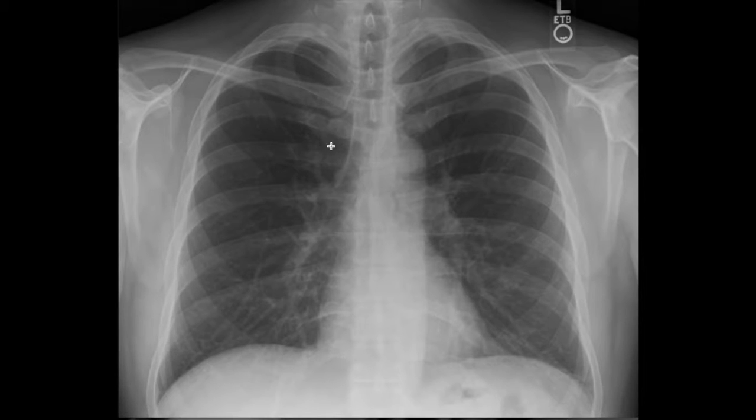Now the ribs we just counted are the posterior ribs. Look at how they elongate, and at some point they take a transverse direction. These are the posterior ribs, and then you have the anterior ribs. This is the shadow right here. Look at them. This is the first rib, the second rib, sorry. This is the posterior aspect, and as it goes to the lateral wall, it diverts to become the anterior rib. So sufficient inspiration again is indicated by 9 to 10 posterior ribs or 7 to 8 anterior ribs. Okay, so these are the ribs.